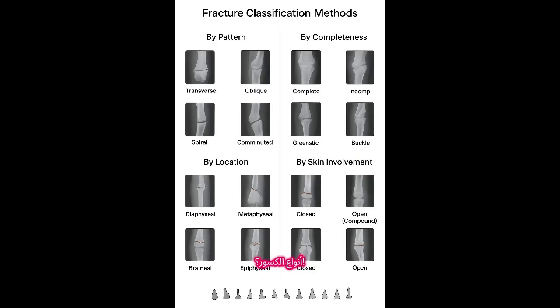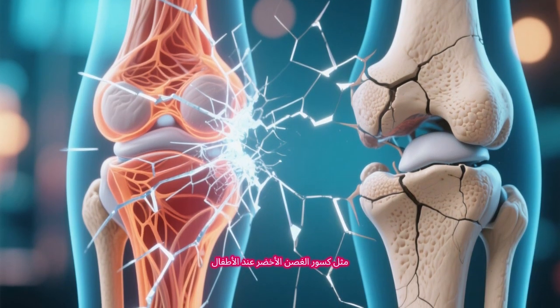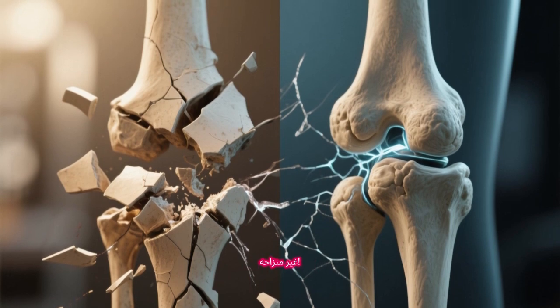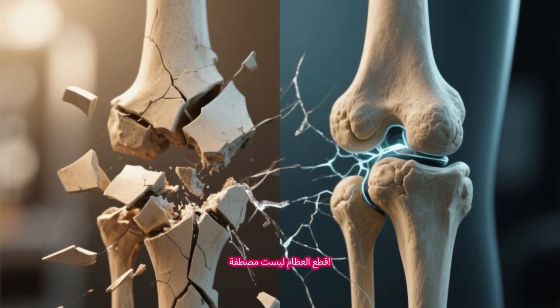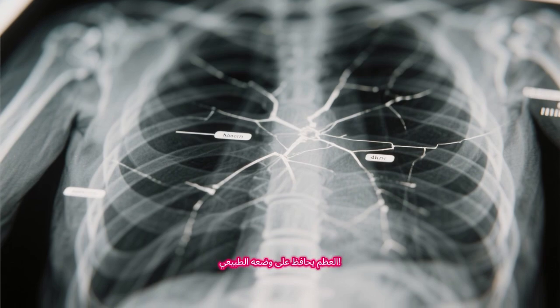Types of fractures. There are different ways to classify fractures. 1. Complete versus incomplete. Complete fractures go all the way through the bone, while incomplete fractures, like greenstick fractures in children, only go part way. 2. Displaced versus non-displaced. In displaced fractures, bone pieces are not aligned. In non-displaced fractures, the bone maintains its normal position.